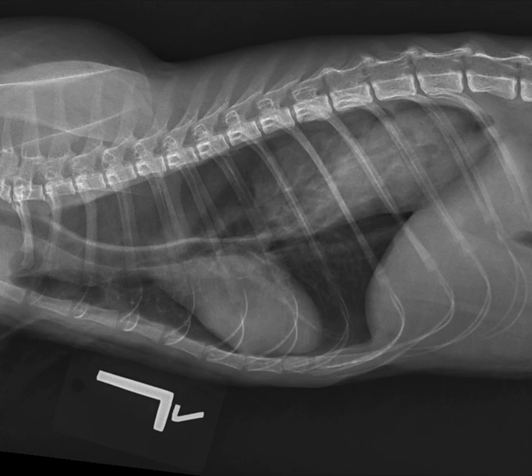Today's example is a juvenile cat found as a stray with ongoing respiratory issues and now acute onset dyspnea. Once you've reviewed the radiographs using a systematic approach, then you're ready to watch this video.